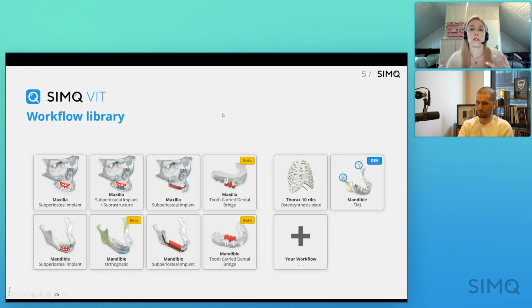And what's really great, and what I want to discuss today, is the workflows aren't just limited here in this anatomical region. We want to work with others and branch out to different sections of the body. So when we find partners and we can co-develop, we can put your workflow here. But again, we'll go into that a little bit more.